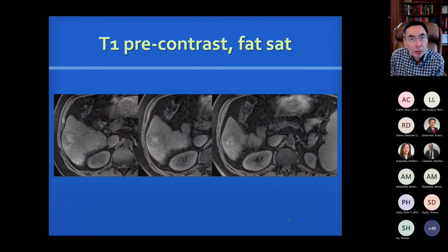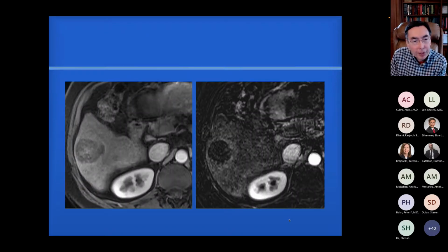Notice that on pre-contrast T1, there is some T1 hyperintensity that might represent blood products. So that would actually be an ancillary feature favoring HCC. On arterial phase imaging, there's no hyperenhancement other than in the capsule, and the rim enhancement you cannot use for arterial phase hyperenhancement.